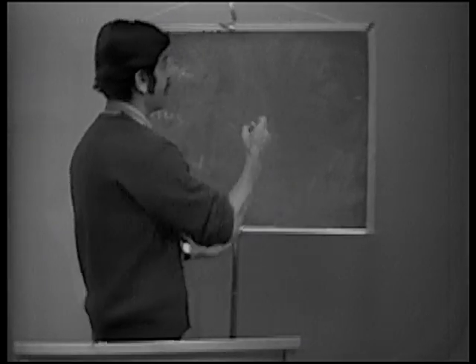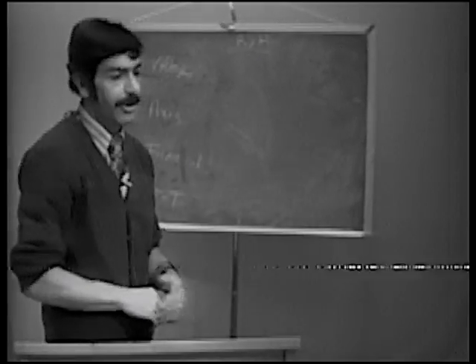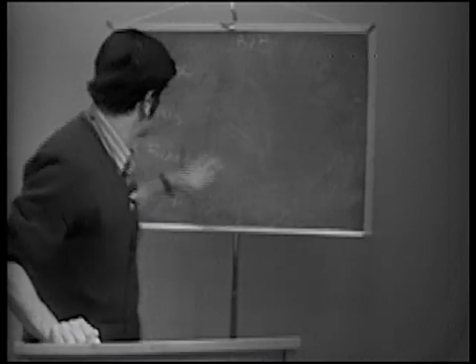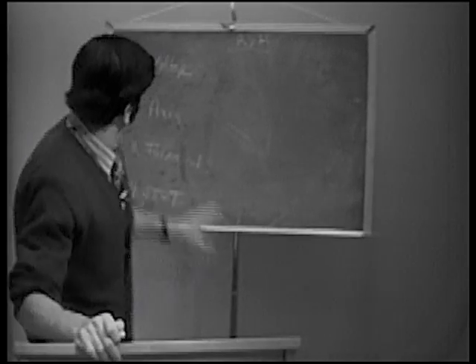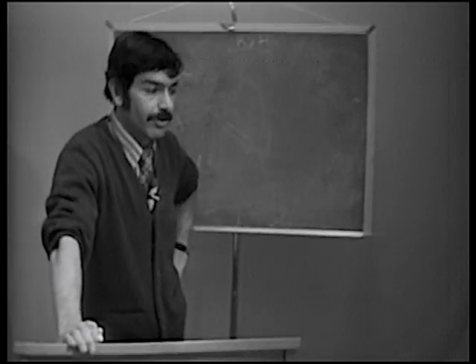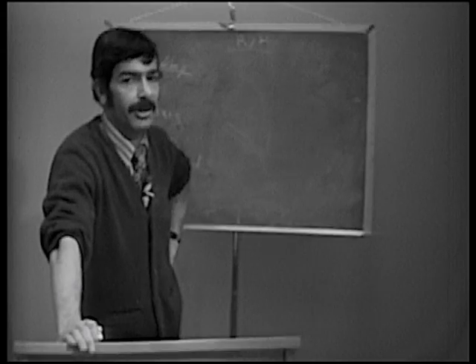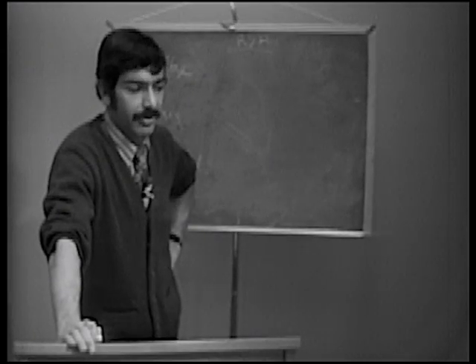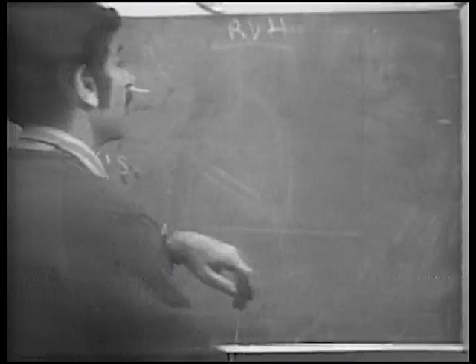Okay, RVH. In RVH, right ventricular hypertrophy, we can use exactly the same guideline: voltage, axis, intrinsicoid, ST wave changes. Okay, so going back to our voltage criteria again, let's list a few of those. These are really very easy. They're easier to remember than LVH. And again, as with LVH, it's worthwhile keeping a few of these numbers in your mind.